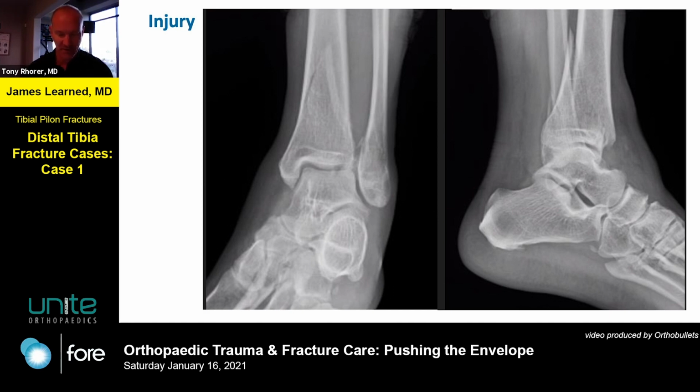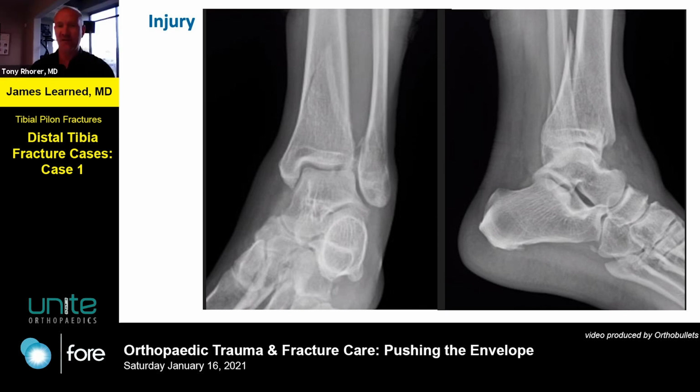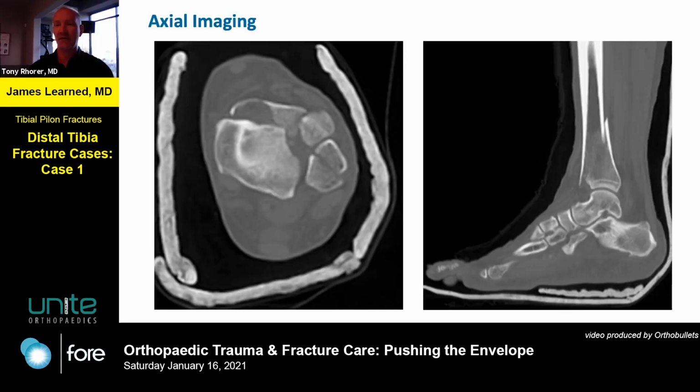That was really cool. So just a few comments: if you go back to your first batch of x-rays and then the injury CT scan, the CT scan actually shows it beautifully. If you look at the image on the right, you see how shortened that is. That's probably 2 centimeters, at least.